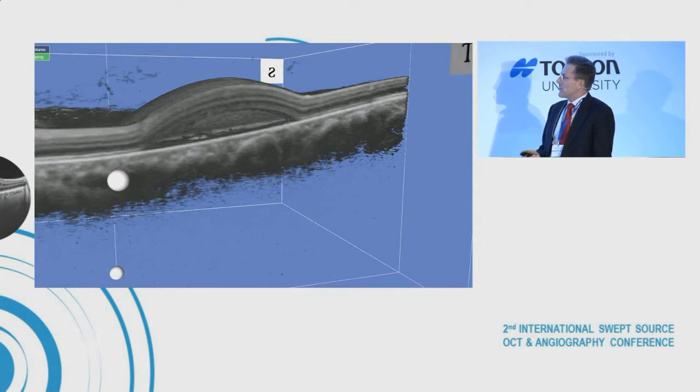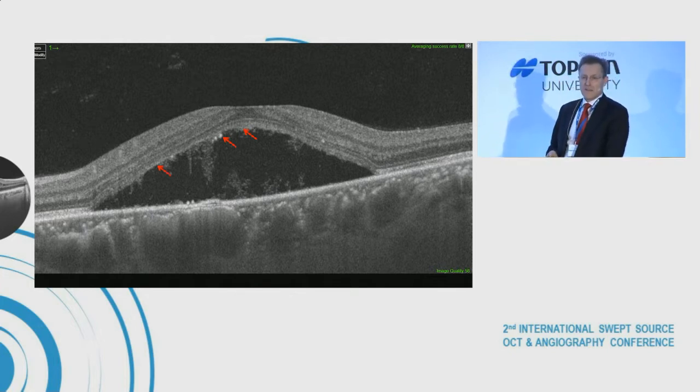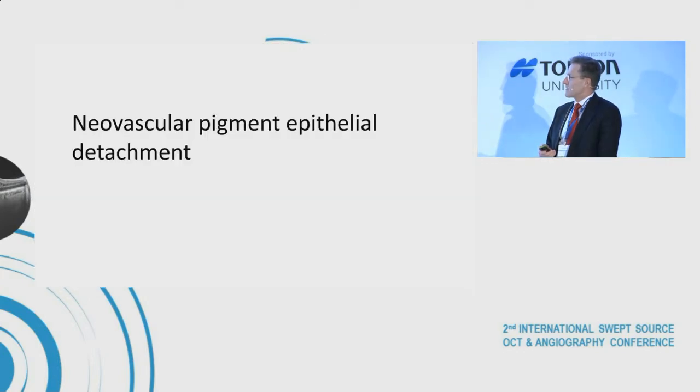Then we move on and summarize the features of the structural OCT, the B scan, and the 3D rendition is composed of lots of parallel B scans that are put together and stacked, and this is possible because the swept source is uniquely fast. And the way it was introduced at our institution in Copenhagen, we saw it merely as an OCT angiography instrument, but there's a lot more in it, and these scans are very fast and very convenient for visualizing and examining patients and their diseases.